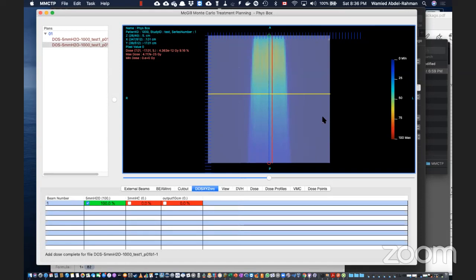Remember, those XYZ show had a problem. The problem was if you don't have uniform voxels, you run into trouble. Yeah, in the display showing things. This is what the Singh actually showed us. I remember that.